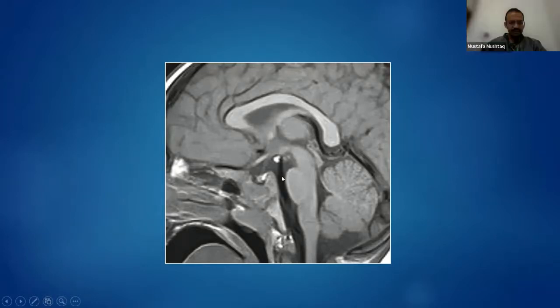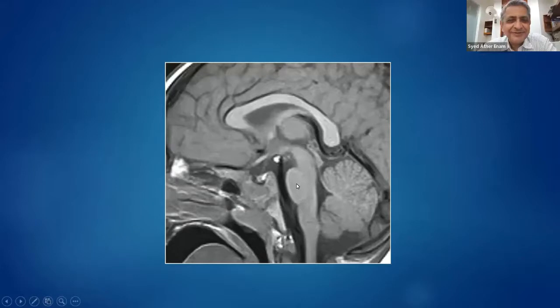So what is this? Okay, so is it a basilar artery? This is a basilar artery. Thrombosis? This is a little thrombosed aneurysm at the tip of the basilar artery. See, so that's the beauty of it. Once you point it out, everything becomes very clear. So those who were thinking about not speaking, now you see it.